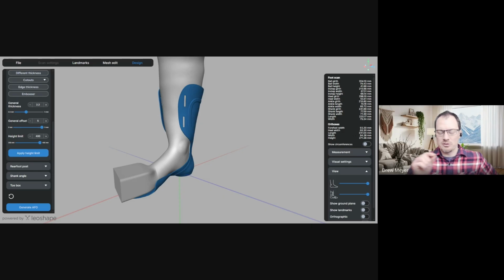And you make a good point. You know, the smoothing tool, you can change the strength slider on it. So a lot of times I'll keep that strength slider low, and then as you click and drag, it's only going to remove a little bit of material. If you have that strength slider up really high, it can remove quite a bit of material very quickly, and so you do want to be careful with that.